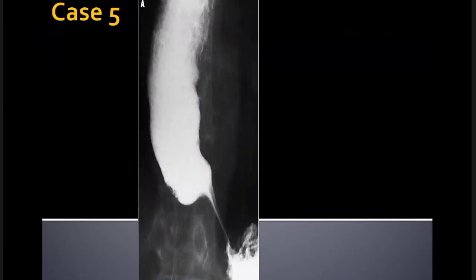Okay, this is a single contrast barium examination of the esophagus, barium swallow examination. 54 years old for abdomen pelvis with IV only. Hello? And the clinical information is to rule out diverticulitis. I think somebody needs to mute their microphone. Yes, of course.